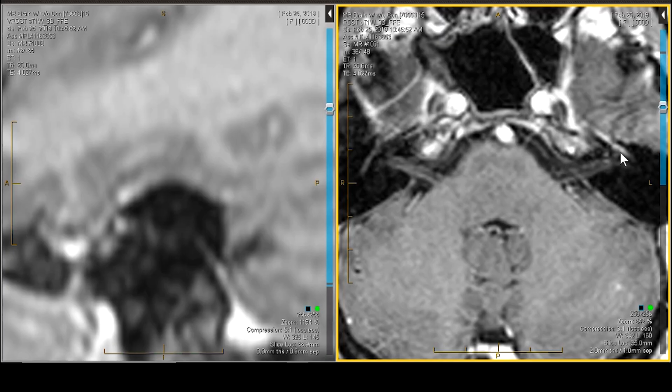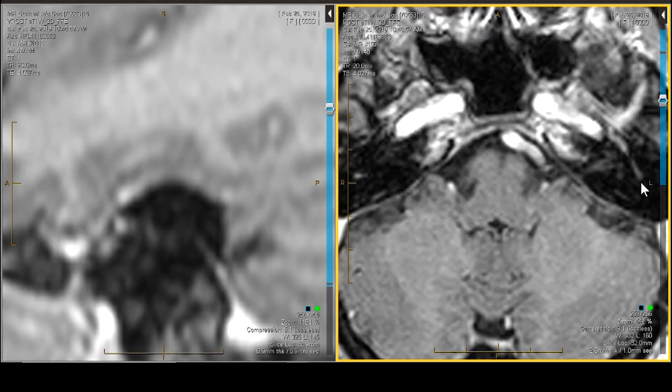You can actually see the ganglion right here as this gray little blob that is covered by this whitish area, which represents the petrosal plexus of veins right next to it, coursing alongside portions of the horizontal tympanic facial nerve. And those will come back to the second curve in the nerve. So we come back to the second curve.